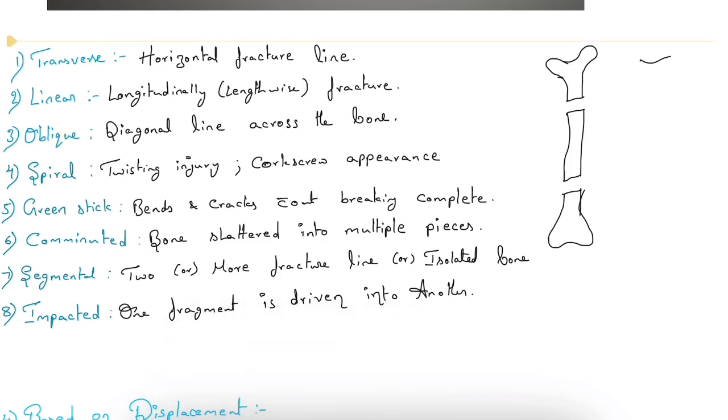Next one, same, this one is also a tibial bone. Now I am discussing this segmental fracture. Okay, this one is an impacted fracture.